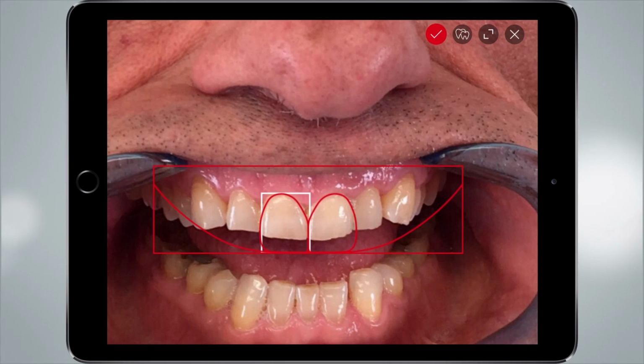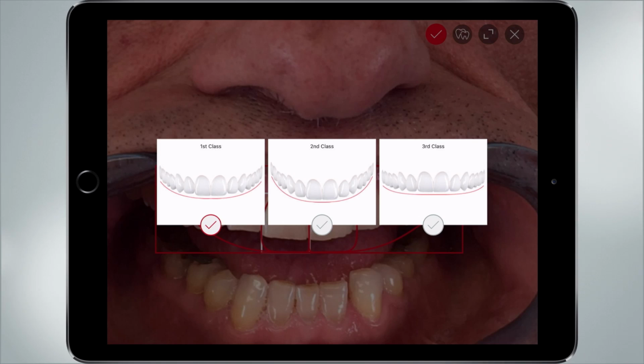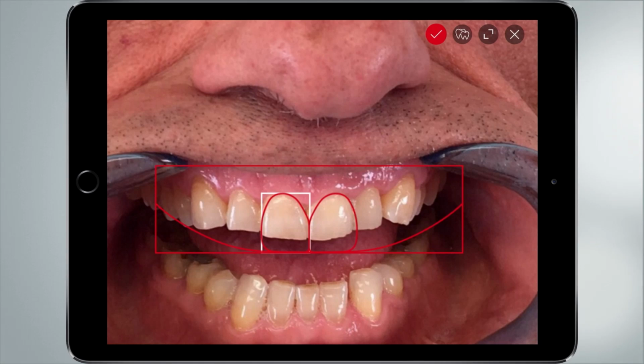Now the length that you want to add. So now we're in the right position. We can also select the curvature. You have to select this one, but you can select also this one here. And that will be showing you that you can add some length here. You can decrease the length over here. Now we accept this situation here.